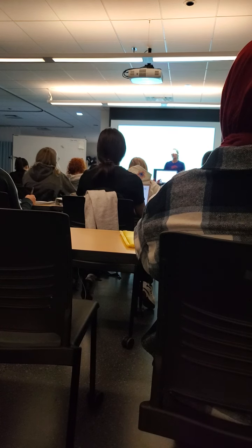So, diabetic, history of stones, leukocytosis, again, because we have an infection going on. This is going to look very similar to that WES sign, but instead of having that very anechoic, black-looking shadow that we see with stones, it's going to be more of a fuzzy, hazy gas shadow. Does that make sense? And then pneumobilia. We're going to evaluate, is there any gas in the biliary tree itself? So pneumo, gas, bilia, biliary. Not just in the gallbladder itself, but have these bacteria crept up into the liver or down the extrahepatic ducts and started producing gas shadow?